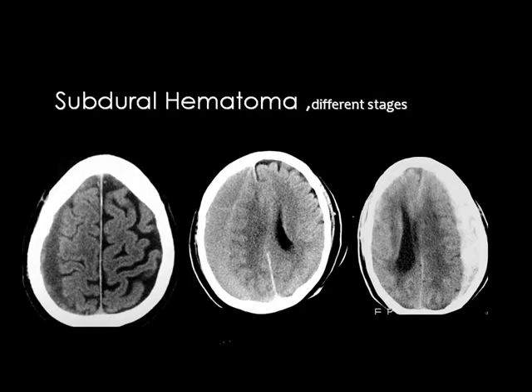Then if you see a hematoma which is hyperdense compared to the brain, you know that this is an acute hematoma.